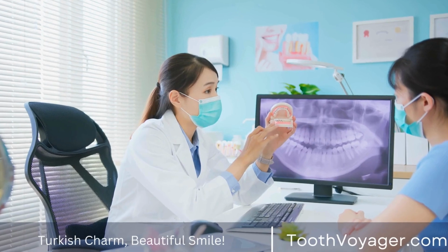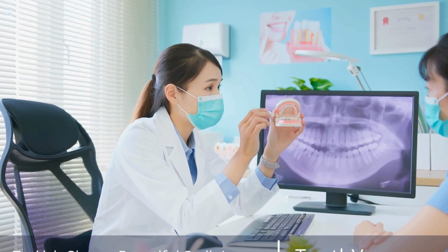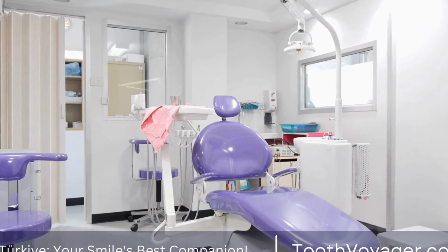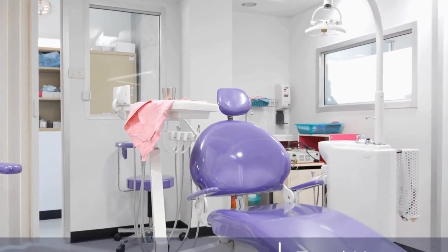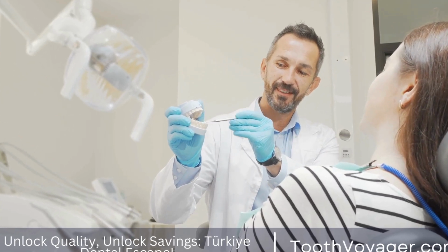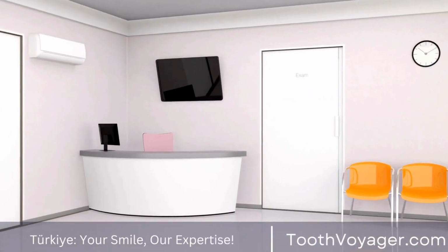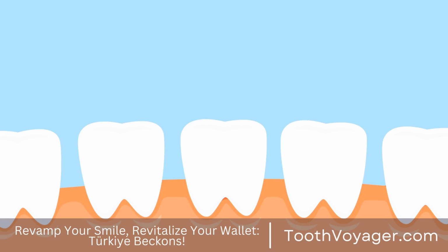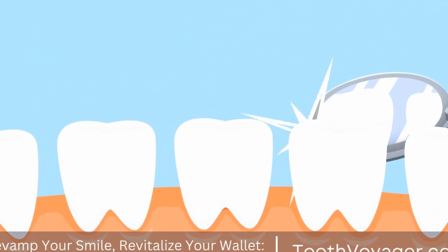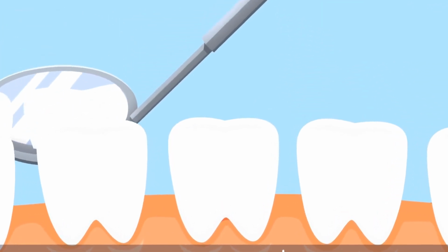Denture manufacturing is a complicated process of making the prosthetics as comfortable as possible. Through working with a professional dentist, patients will be able to ensure that their dentures sit perfectly in their mouths and perform effectively. The custom dentures will not only improve dental function, they can also boost the appearance of the patient's smile. This can increase confidence and self-confidence. If you're considering dentures, ensure that you speak with a reliable dental professional who is able to design prosthetics that will meet your expectations and give you the optimal comfort.